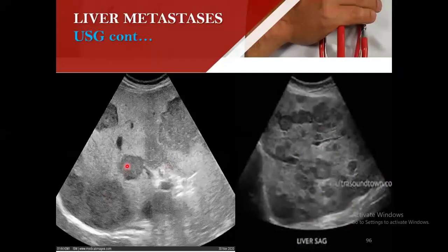Have you seen the metastasis? Metastasis spreads too much because it is a spreading cancer. When it gets to an organ, like the liver, it spreads quickly. But for the HCC, it's a primary cancer, so it can be just 1 or 2 lesions in the liver. But metastasis spreads like that. Anytime we hear of metastasis, it is spreading. That's the term, spreading.